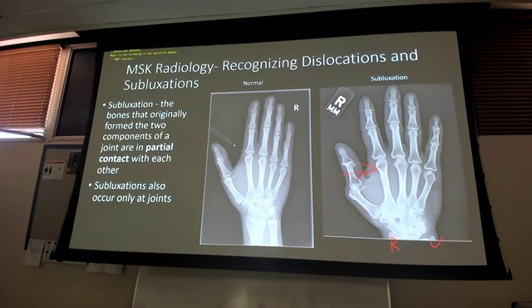Right, because that's the part that's shifted. Yeah, the last one when I said an anterior knee dislocation, you can still very easily say anterior dislocation of the tib fib if you want. That's an appropriate way to say it as well. Just the knee's a lot easier to describe because we just got those bones that connect, right? But here, because there's other bones, we name the bone.